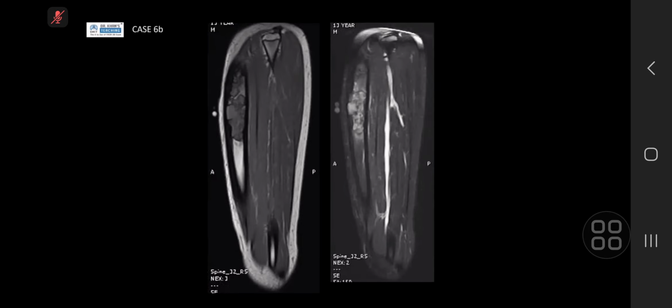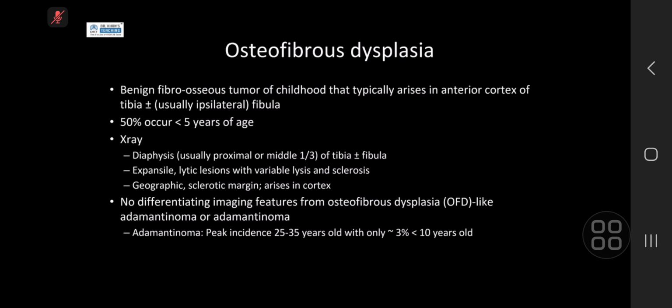So in a pediatric population, we're thinking about osteofibrous dysplasia, fibrous dysplasia. This is a nice example of osteofibrous dysplasia. It has that mixed density. You have that nice sclerotic margin with a slightly fibrous component internally. There's no real aggressive features. The patient did have previously a pathological fracture. We could see that nicely in candidate 2. It described that really nicely when there was thickening and a linear lucency within the anterior cortex.